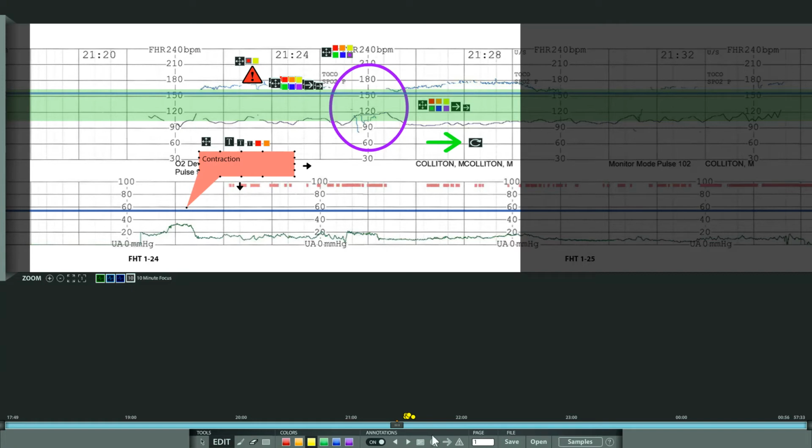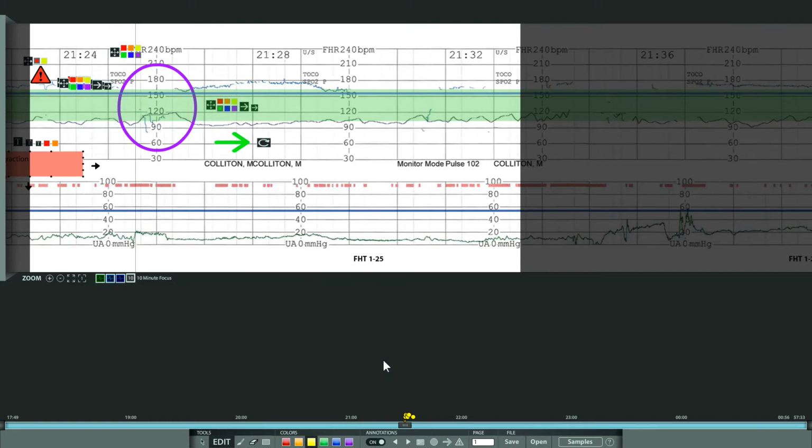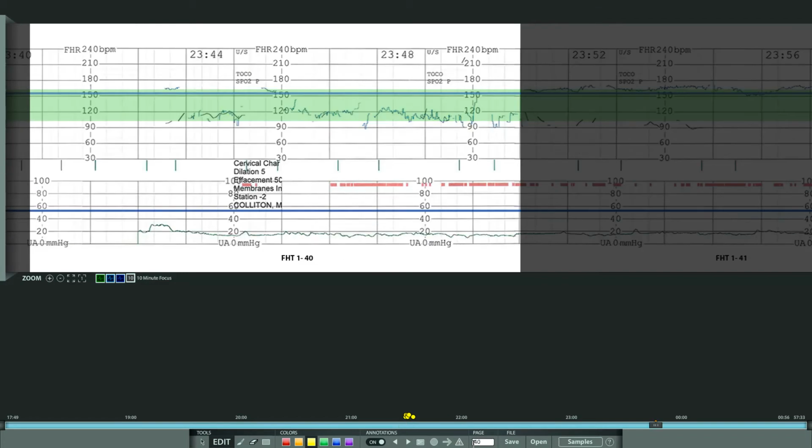There's another part built in here where we'll have the page number from once these are all stitched together of which page it was, probably in the records, and you will be able to type in that number down here. If I want to go to page 40 and press enter, and it'll go straight to that spot.